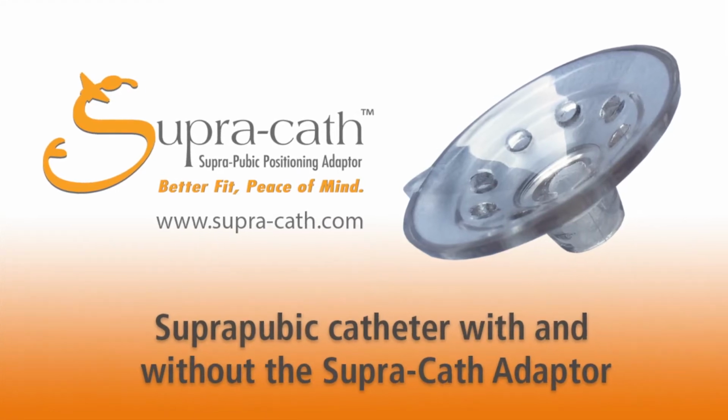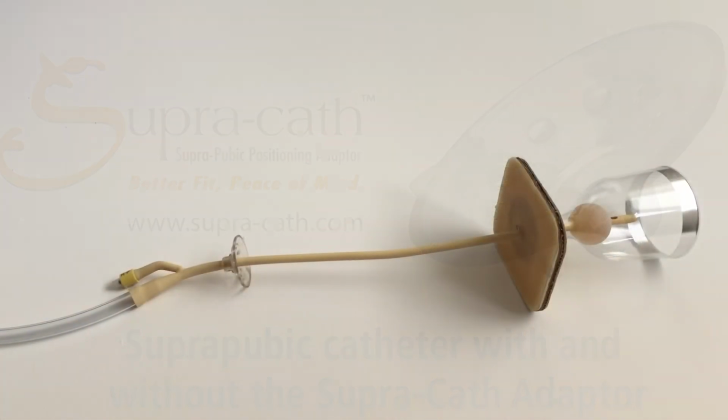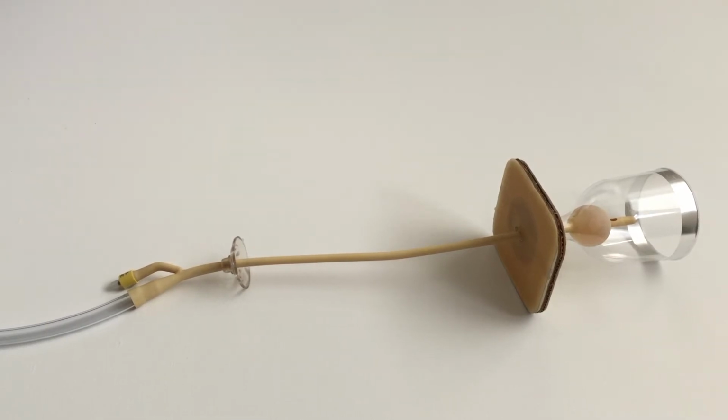The Cath suprapubic positioning adapter. What you see here is a functional display of what actually occurs within the patient's body with a suprapubic bladder when using just an ordinary urinary, urethral, or Foley catheter for its drainage.